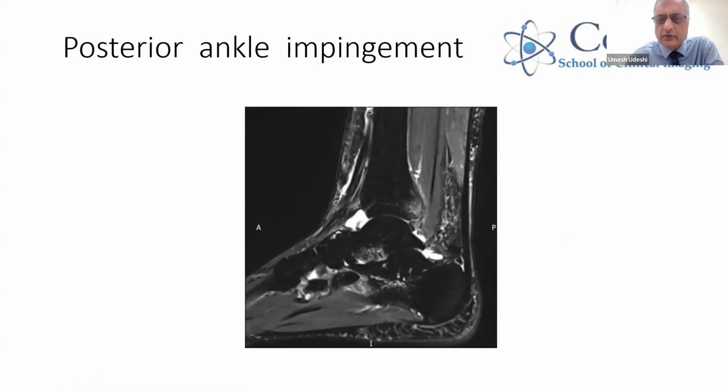This is a condition called, you can get anterior and posterior impingement, which can be bony or it can be soft tissue. Particularly posteriorly, it may be soft tissue that's causing the impingement. So here the posterior tibia may be impinging on this plica or synovial fold, which is thickened and abnormal looking. And then in plantar flexion, you can get pain here at the posterior side of the ankle joint. You may get osteophytosis or degenerative change both anterior and posteriorly also, which could cause the impingement.